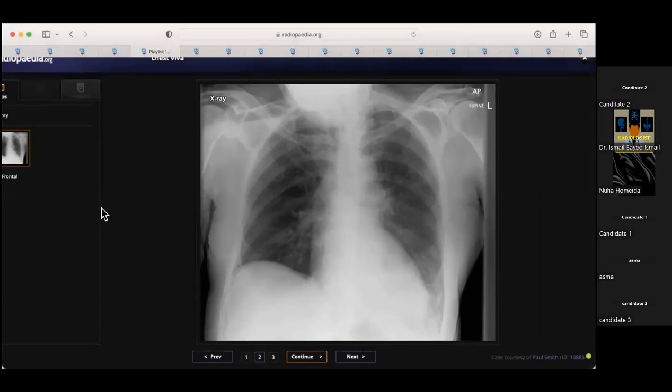So I'd like to check the previous images, if available, to assess this lesion. And I will urgently convey my findings to the referring physician regarding the pneumothorax and the deep sulcus sign. And I'd like to do a contrast-enhanced CT scan for further investigation. Okay, so that's just a simple case.